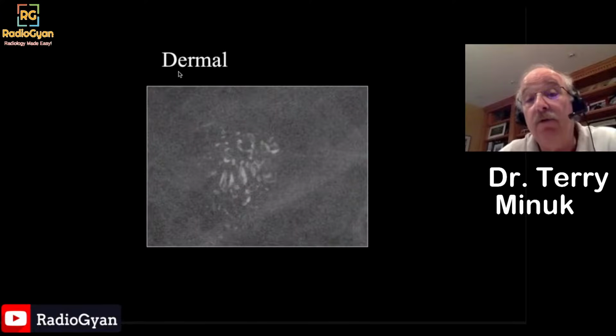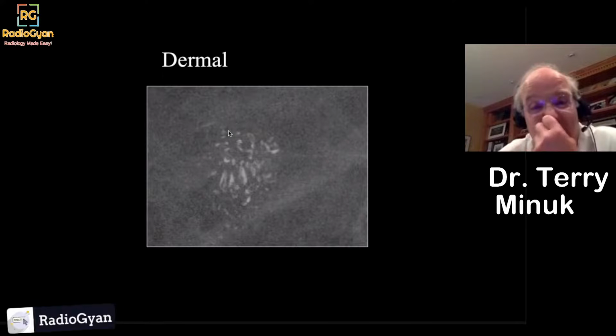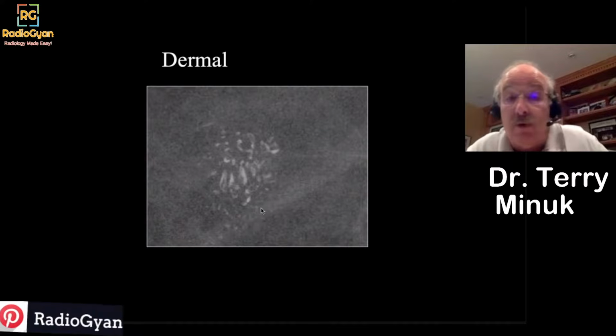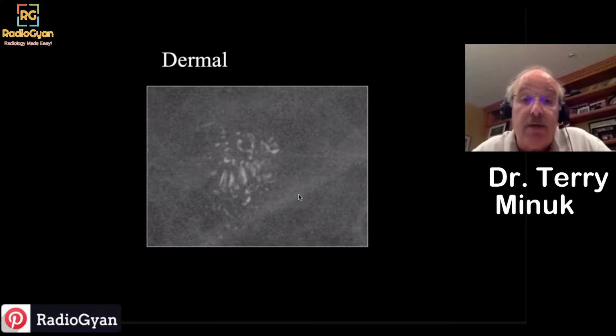I'd better look, this is dermal. This is in a mole. This is probably talcum powder in a mole on the skin surface. You don't want to be biopsying them, but you may have to do tangential views and check carefully if the patient has moles on the skin, because things can get in those moles and mimic calcifications.